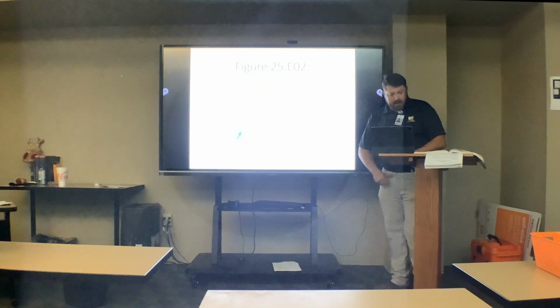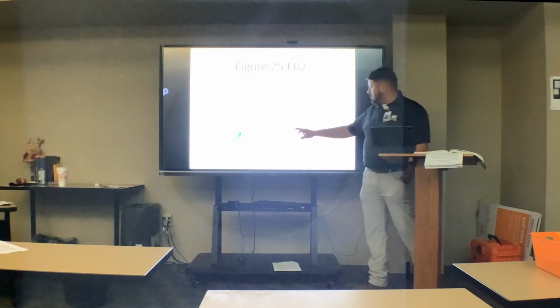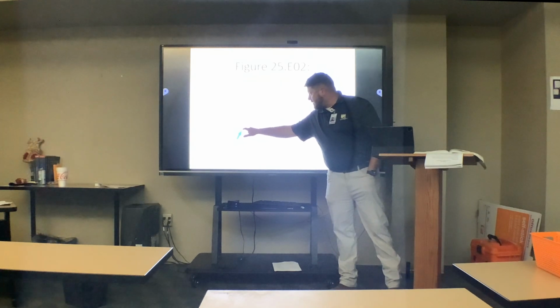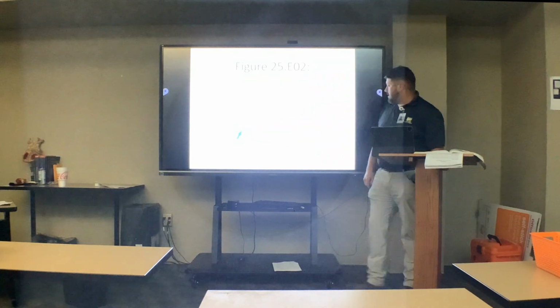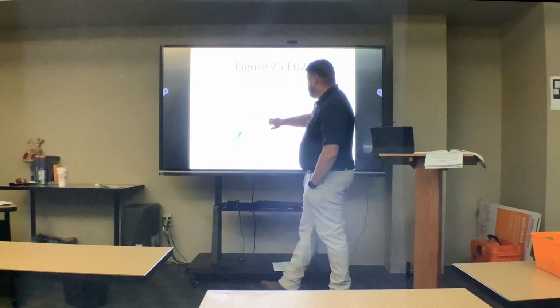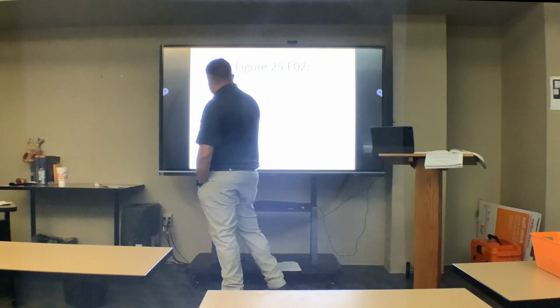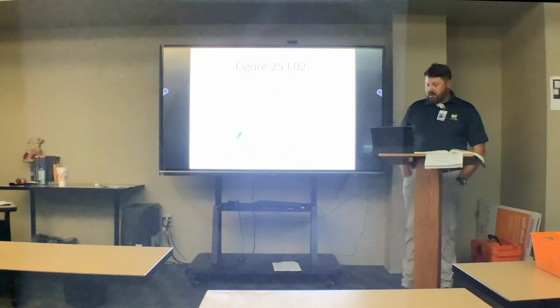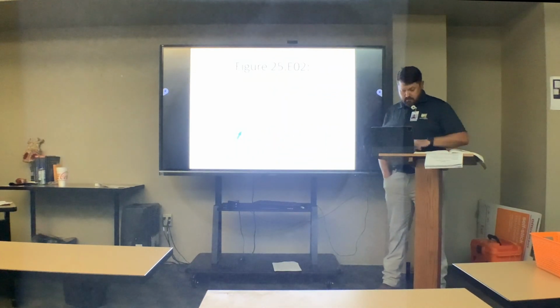All right? Now, in this case, you've got this pseudo S wave right here. You can kind of see it where it's got that indentation there. All right, this is a really fast rate. 190. If they are stable with this, they're not going to be stable for a real long time.